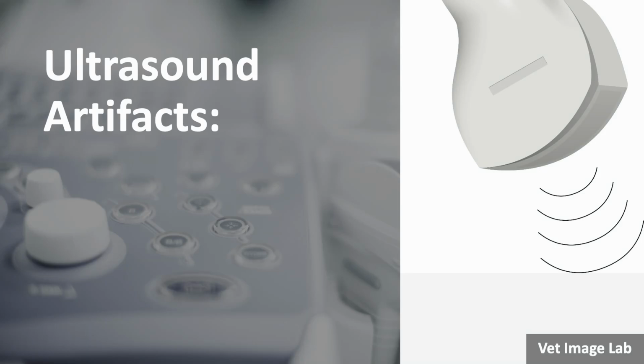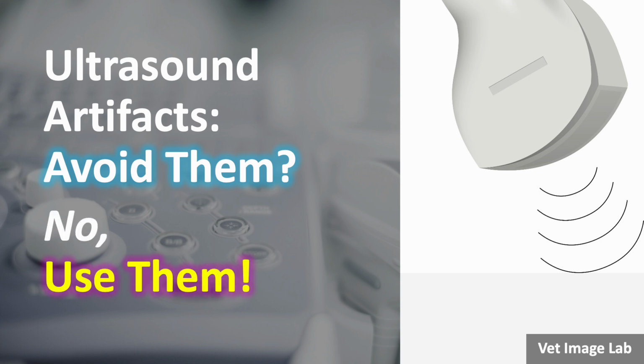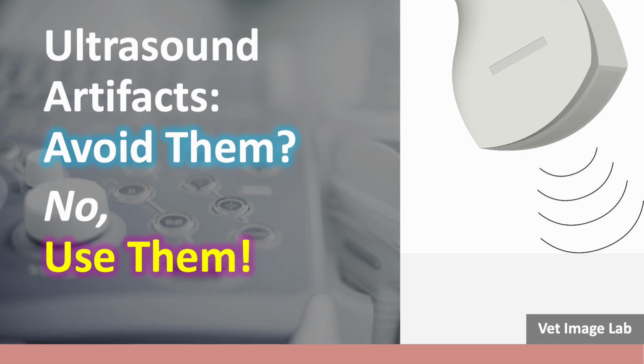When we think of ultrasound artifacts, we often see them as errors, something to be avoided or corrected. But many artifacts actually help us make more accurate diagnoses. Instead of simply avoiding artifacts, we're going to learn how to recognize, understand, and even use them to improve our diagnostic accuracy. Let's get started.